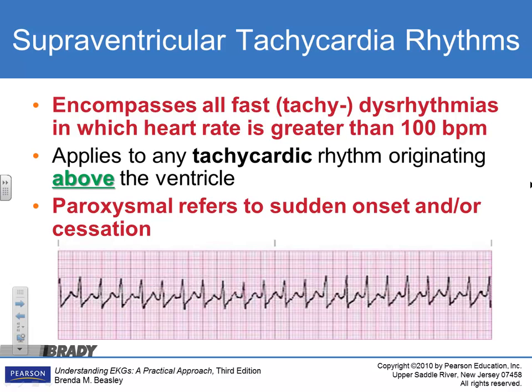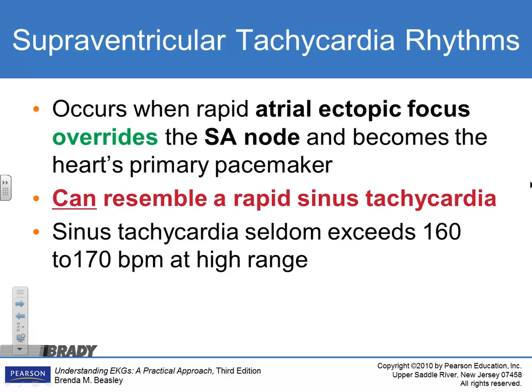Paroxysmal, as I said. Is this paroxysmal? By looking at it, can we see that it's paroxysmal or not? If this is all we have, this is not paroxysmal. Paroxysmal has a definite start and a definite stop. It may be intermittent, but it's a sudden onset or sudden cessation. You may have a patient in SVT, and you get them to cough or do something and they break it, and then they go into a normal sinus rhythm. That would be paroxysmal. All right, you got that? Okay.